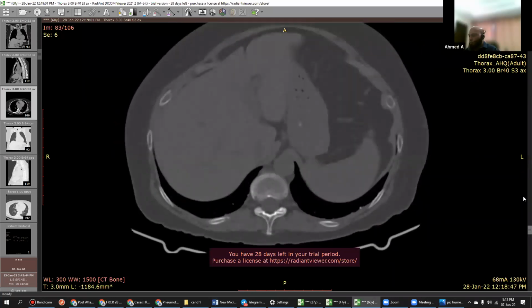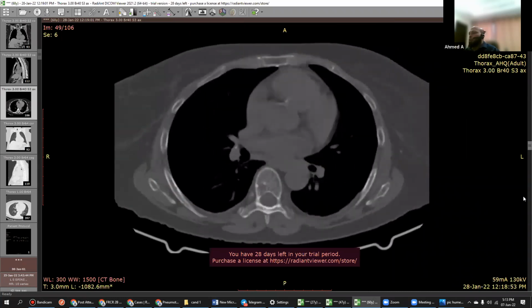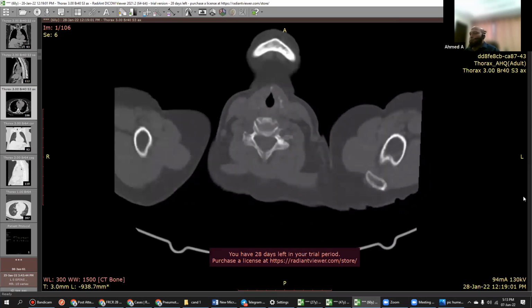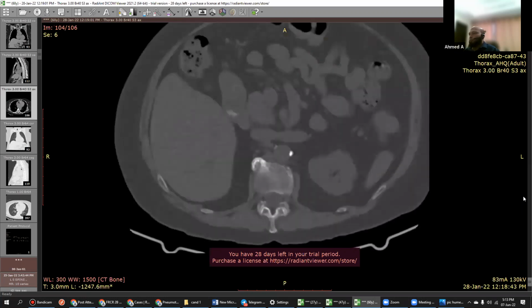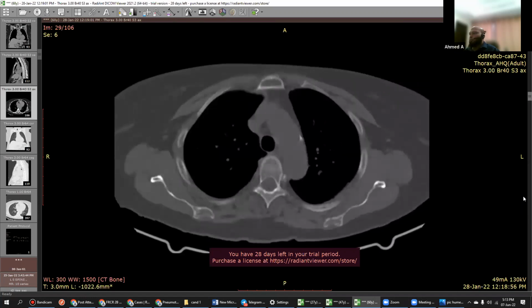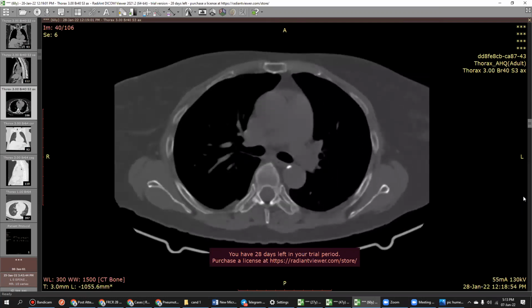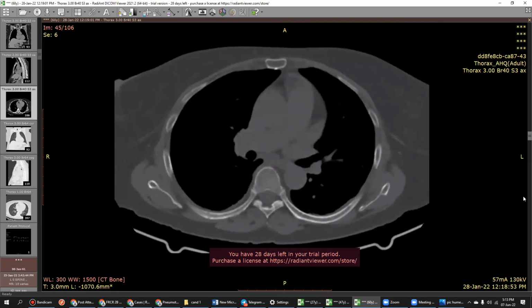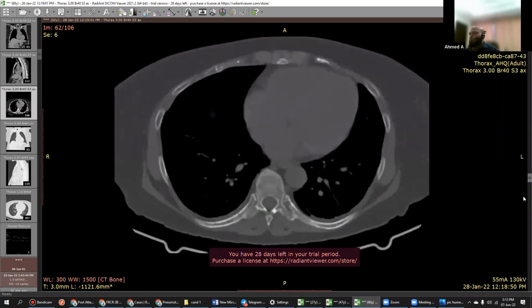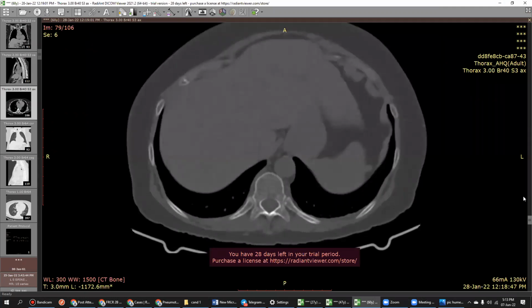Just focus again. This patient had come to me in the same way, with chest pain. That's it. Something may be wrong in the right ribs. I think there is some irregularity in the right anterior lower ribs, near the liver. Yeah, here.